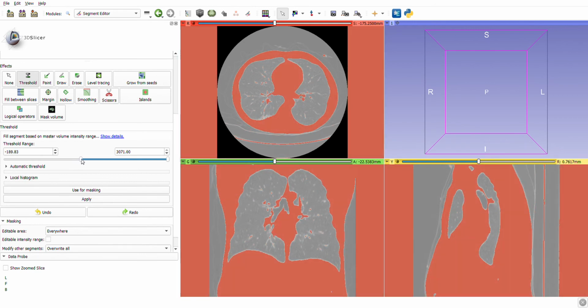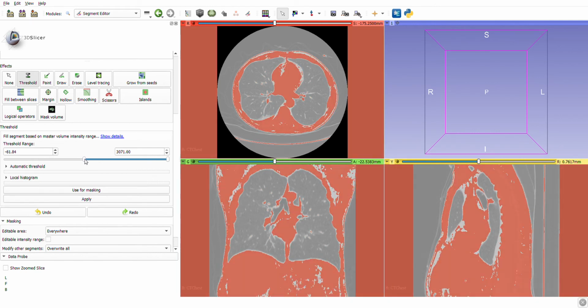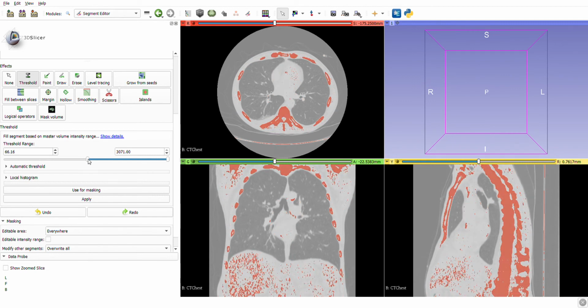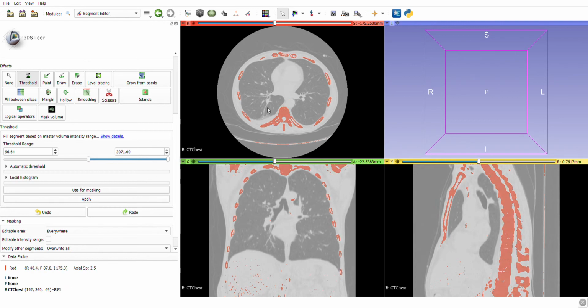So this is then trial and error. The more you practice, the better you'll get at the detailing of this part. Since I have used this software multiple times, it's easy for me, but for you, you need to practice for different parts.